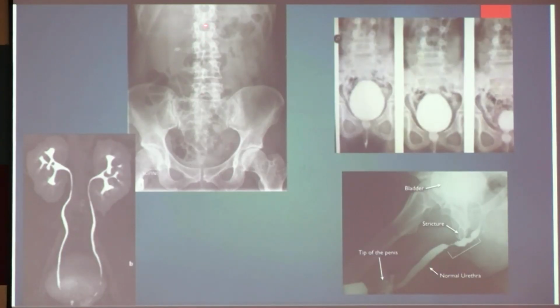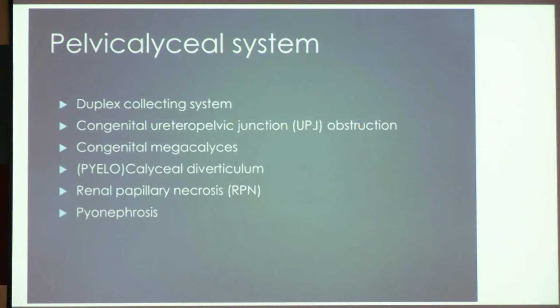I was just saying that we can have a faint idea about the kidney outline. So this is the kidney outline which is there. This is basically not having any pelvicalyceal system that is getting enlightened. So basically it is a control film. It is a non-contrast film. It is basically a plain X-ray KUB. A normal X-ray will be able to easily identify the stone if there is very good bowel preparation. And this is something which is an IVP imaging. This is an RGU study which we'll be seeing later.